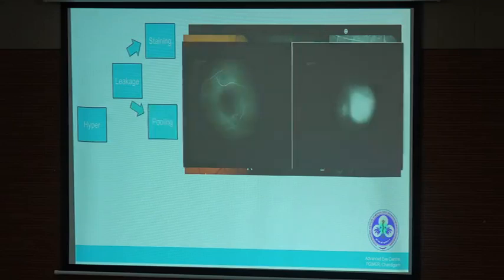Now, which is pooling. What do you call this? Pooling again. See, you can see a big one. This is exactly what we see in a CSR patient, or a patient where the pigment epithelial detachment is there. You have a dye leakage which is more than what normal should be, but it becomes more in the late phase, and because it is remaining in this space only, and is not going outside that space, we say the dye has pooled here. And what is this swimming pool called? It's called pigment epithelial detachment. All right, so this is how a pooling will look.